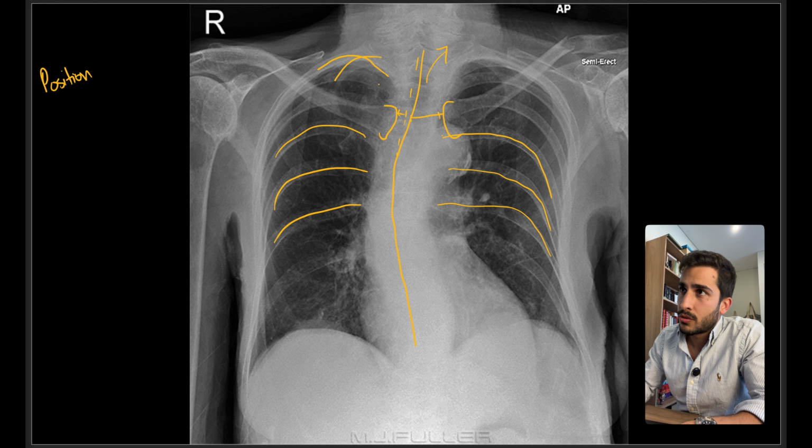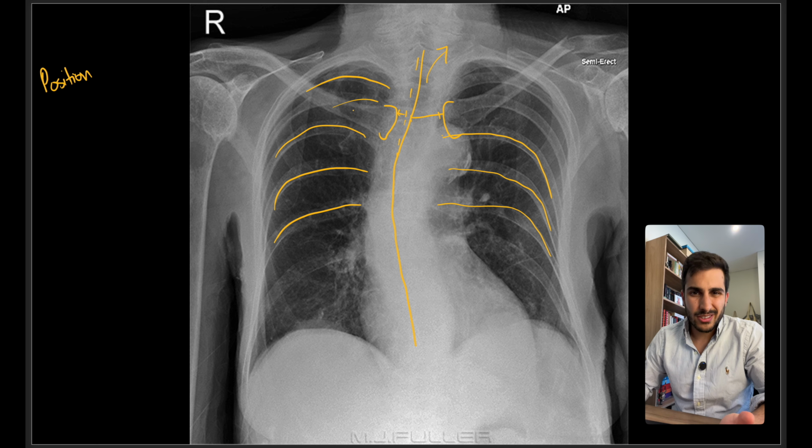Okay. So rib number 1 is always that sort of C-looking shape. Rib number 2, again, is sort of mostly overlapping. It's right there. Rib number 3 is right below that, and then this is rib number 4. So about 3 to 4 ribs.